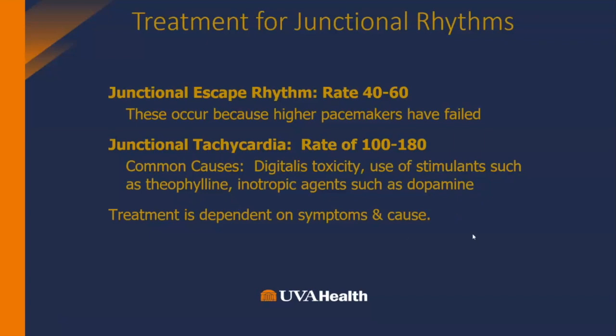And again, what you're looking for is why is this happening? What are some of the causes? If they are bradycardic and hypotensive, they may not respond to medication therapy, so you may need to use transcutaneous pacing as a treatment.